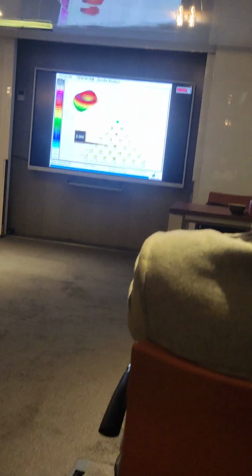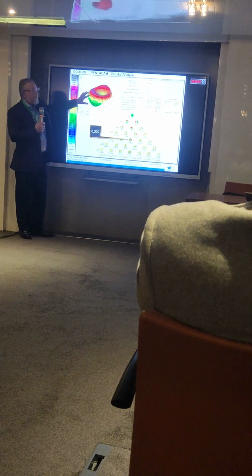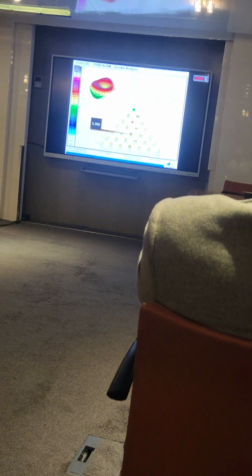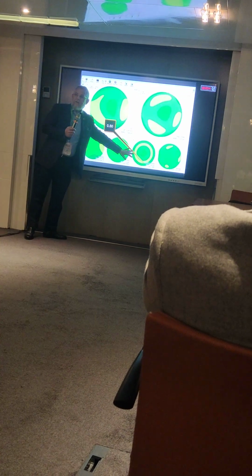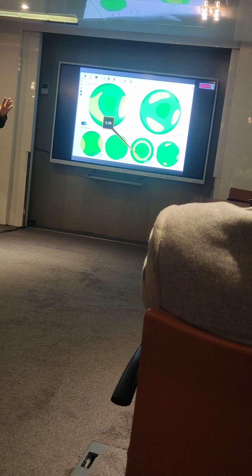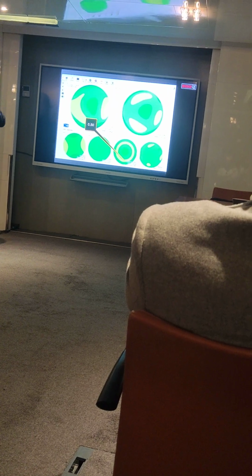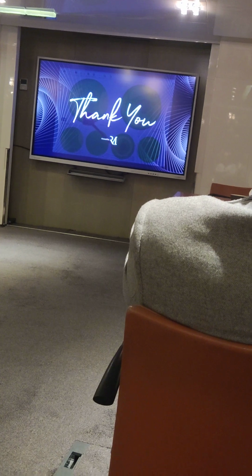Okay, so now, as you see, the spherical aberration with the Pentacam is 0.3, while in Cyrus, it is 0.5. Same patient. And I noticed this in many patients when I do comparison: I find that the Cyrus gives 0.2 more, in the RMS and in the individual aberrations as well. So 20 minutes finished?